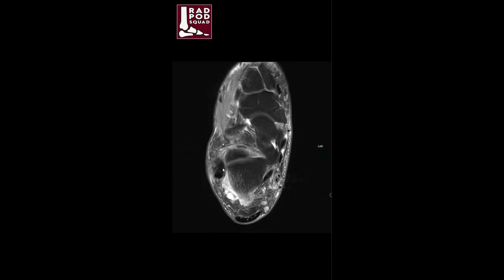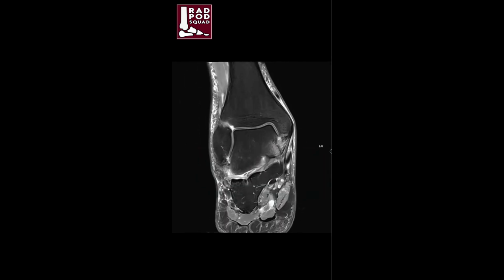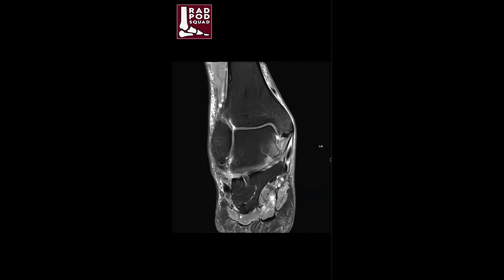Moving to the peroneus brevis inframalleolar tendinosis seen here, I like to see this on the coronal images with a coronal oblique, and we can see the peroneus brevis get to its insertion, and of course moving along the longus through the cuboid tunnel.